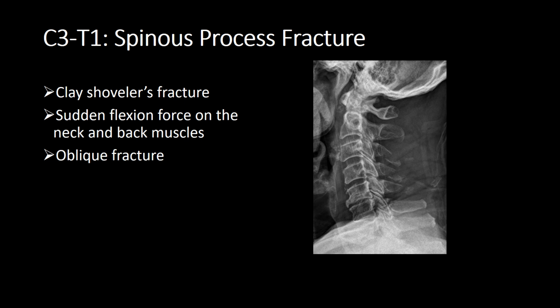Okay, so B is bone, yeah, that's fine. Anterior tubercle, odontoid peg, and vertebral body C2, C3, C4, C5, C6. Let's look at the articular pillars. Let's look at the posterior arch of C1, the lamina. And we can now see a little fracture there through the spinous process of C6.